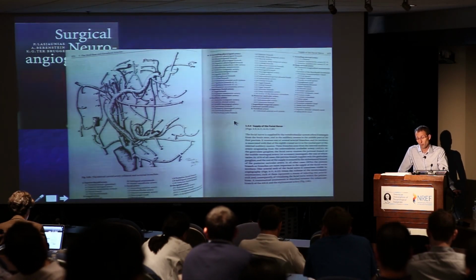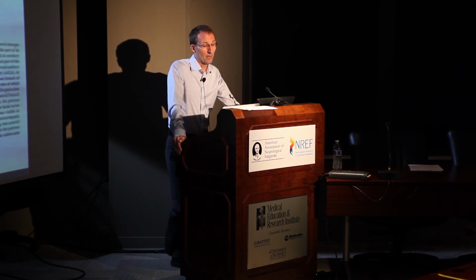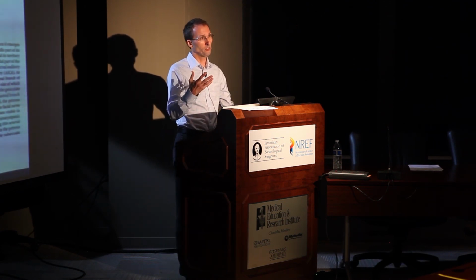Okay, so the point is, in normal anatomy, you often don't see these at all, right? But when they tend to supply dural fistulas, they become markedly enlarged. So the anatomy that we see with dural fistulas, again, is just not something we're used to. It's not something I'm used to every time. And so I find references like this extremely useful.